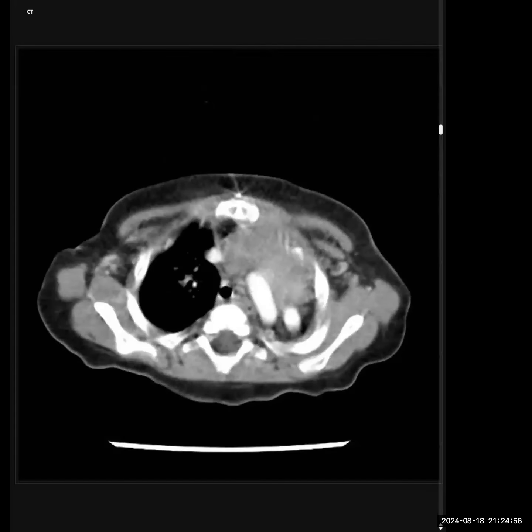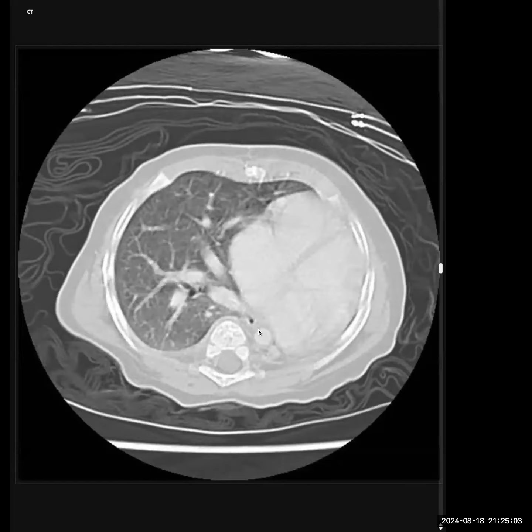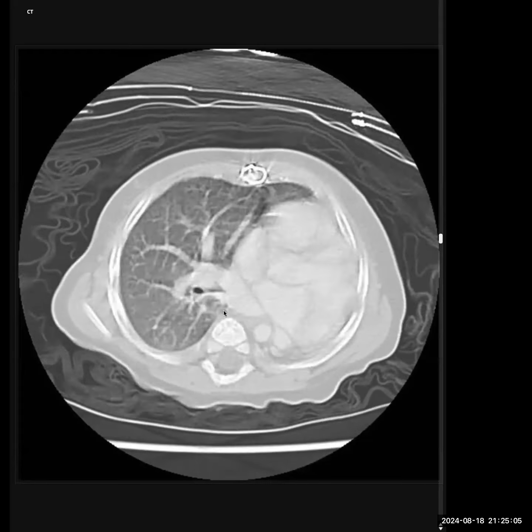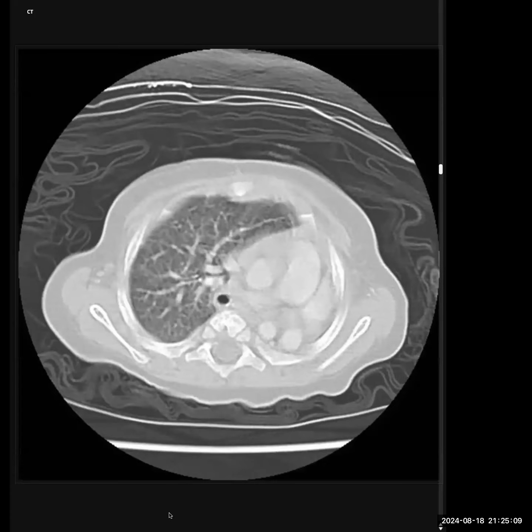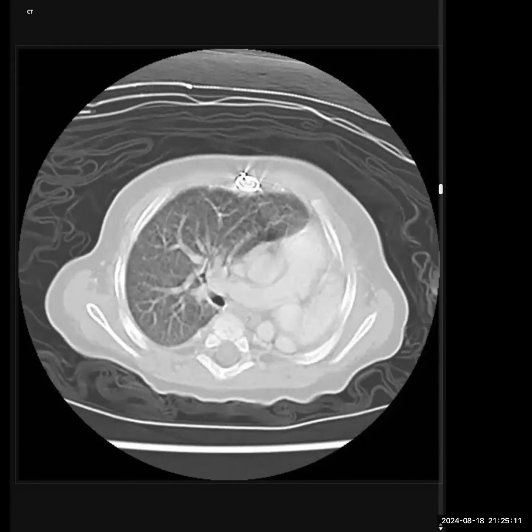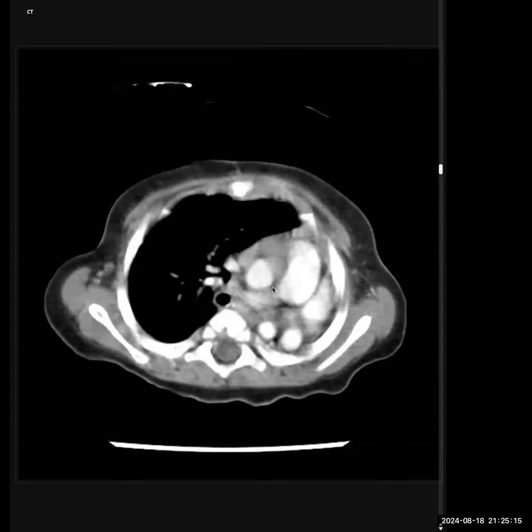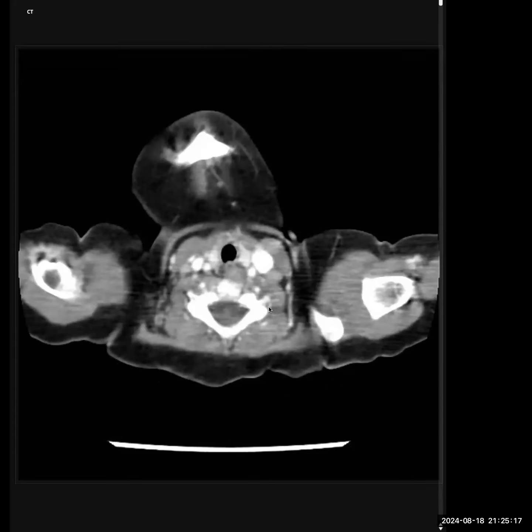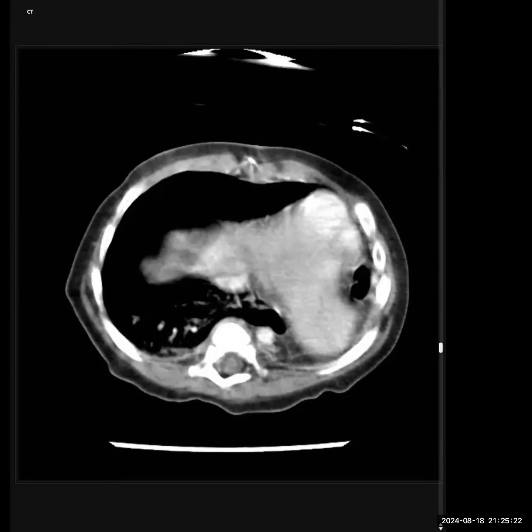This was well done. In fact, you considered the pathology right in the X-ray as well. So yes, there is a little bit of the left bronchus, which you would have seen if you had more time. But given that you started with the axial one, you noted that the left pulmonary artery is absent, and this is a case of left bronchial atresia along with left pulmonary atresia as well. Well done. I'm happy with the way you dealt with the whole thing.